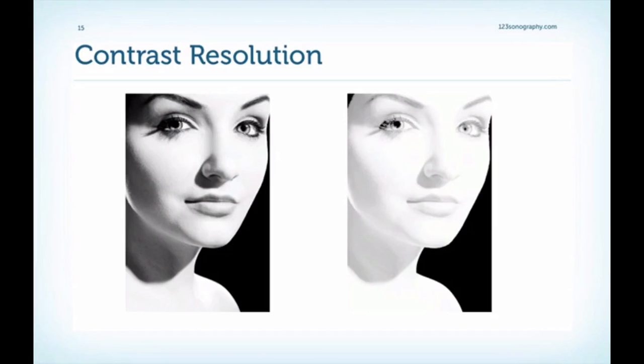And contrast resolution is the ability to discern between different grayscale values. On the left-hand side, we have an example with very high contrast resolution. You can see many details here, detailed gray values, while we do not have that here on the right-hand side. In other words, we're losing information in this image here. Another factor that influences the contrast resolution is acoustical noise. This will be discussed later.